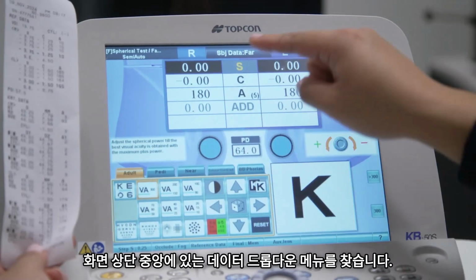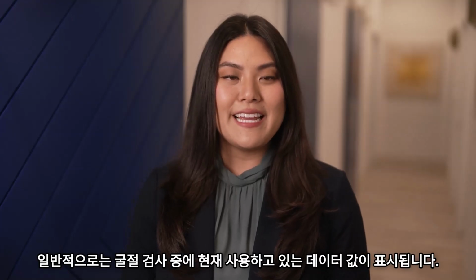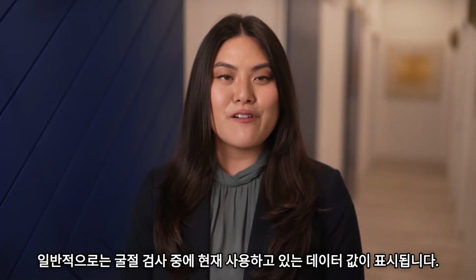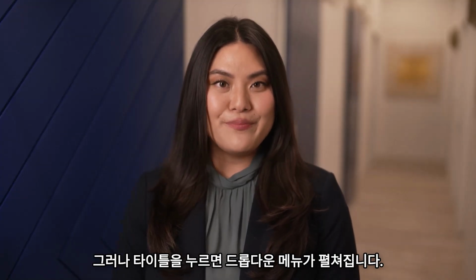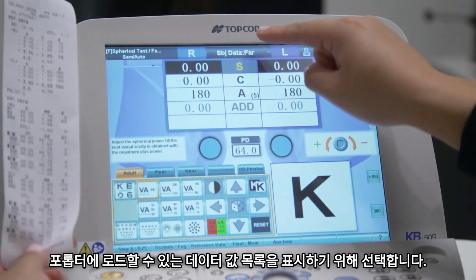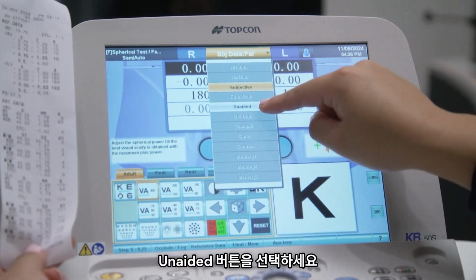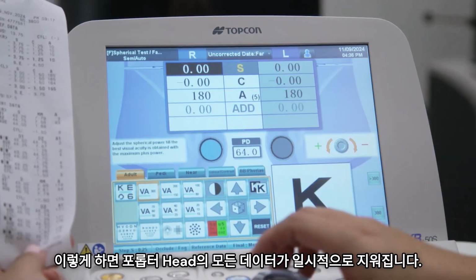Locate the data drop-down menu at the top middle of the screen. Normally, this displays the data values currently in use during the refraction. However, the title is also a drop-down menu. Select to reveal a list of data values that can be loaded into the phoropter. Choose the Unaided button. This will temporarily clear any data from the phoropter head.